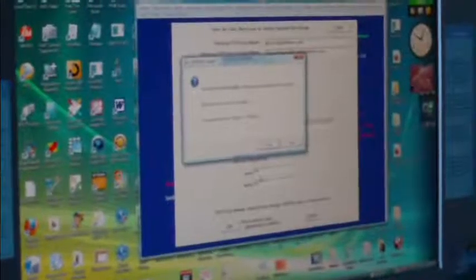In case there was some mistake, you just say no. But if indeed you do want to add this computer because you are the same user using the same data set simply from different computers, then what you click on now is yes, that you do want to add this computer to that Internet Data Storage location.